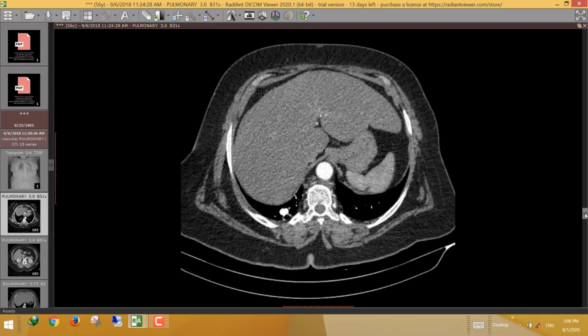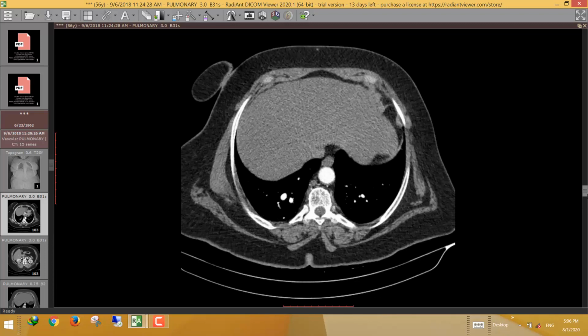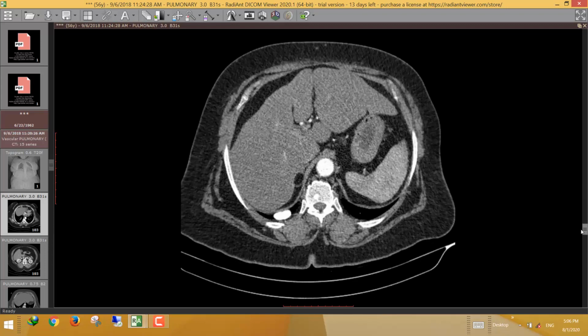So this is characteristic for high flow vascular malformations. Here this is called pulmonary AVM, and in the textbook it is called AVM, and this is the famous name, but it is an AV fistula.